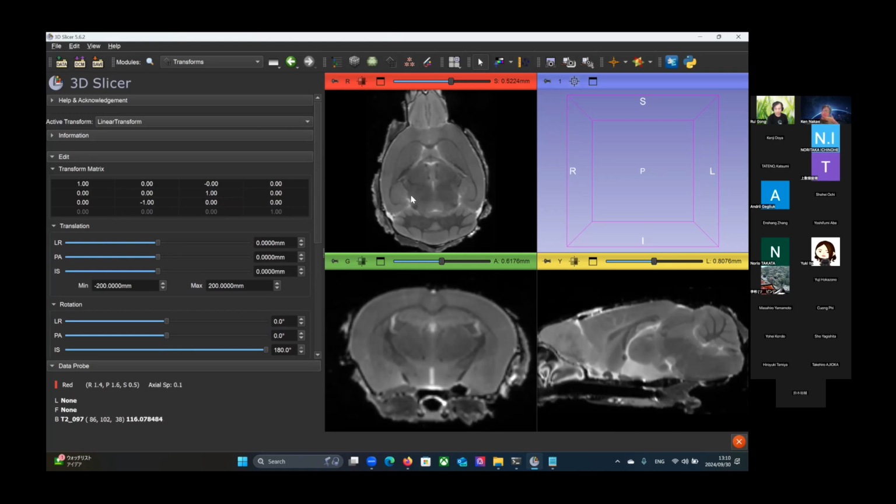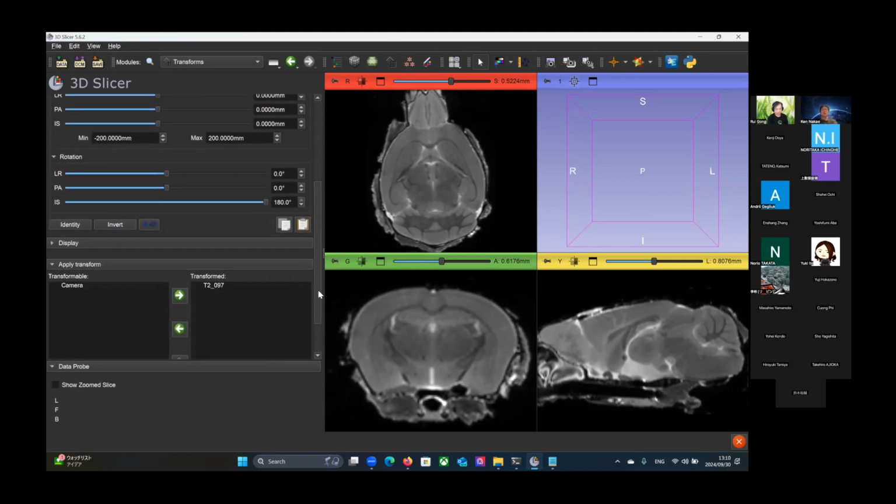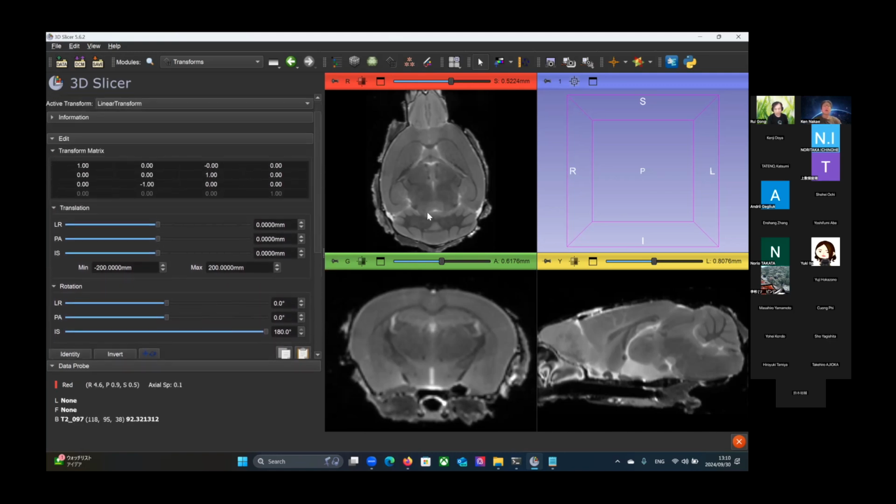Otherwise, if 3D Slicer just treats the images as a series of intensity information, it may disrupt the original information about the orientation. I mean, the original orientation should be what we saw before. That's just the raw data. Not just the raw data, but if the NIfTI file also contains rotation information, then I'm not sure. Using Slicer, we need to check.